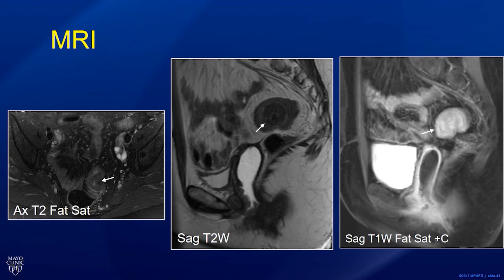So this patient continued on to MRI, and we see here a mushroom cap type configuration lesion, T2 hypointense with delayed enhancement and preserved T2 hyperintense mucosa. So even though this patient has had hysterectomy, the bowel invasive endometriosis is still present in her pelvis. And I would again advocate looking at all the planes of imaging. On the axial imaging, it can be very easy to potentially overlook this area.